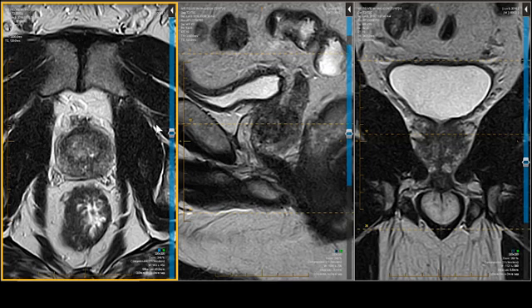Yeah, we have a couple of dots. The major criteria for the peripheral zone, no diffusion restriction. And we're going to see we don't have any diffusion restriction. So we have no major criteria met in either zone.